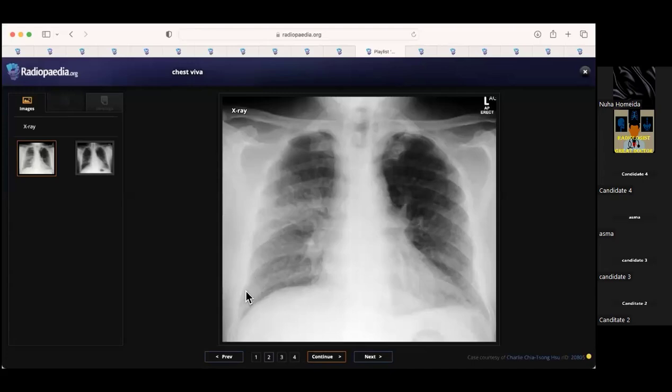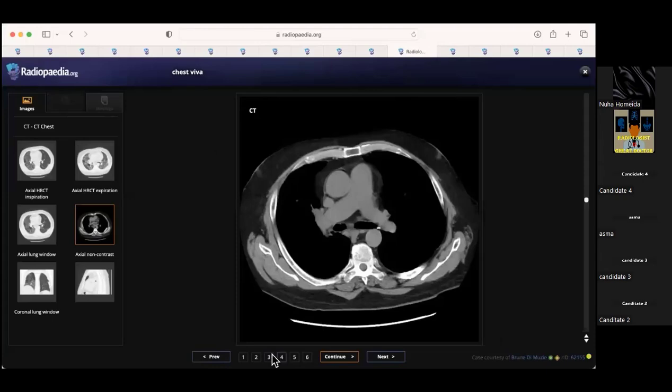And this was a case of unilateral interstitial lung changes. So we've said two main ones. We can have a unilateral pulmonary edema in heart failure, or it could be lymphangitis carcinomatosis. So these are two main differentials, and we've discussed the management.